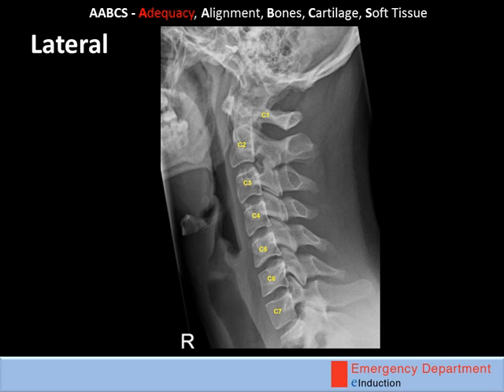An adequate lateral spine's view should show you the first half of the vertebral body of T1 and the other 7 cervical vertebral bodies. If you have an X-ray which does not show you T1, then you can still review it. It may have some important clinical findings, but you'll need to formulate a plan of how to image this section, either with X-rays or CT, before you attempt to clear the C-spine.